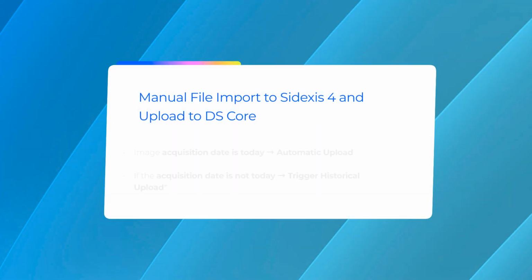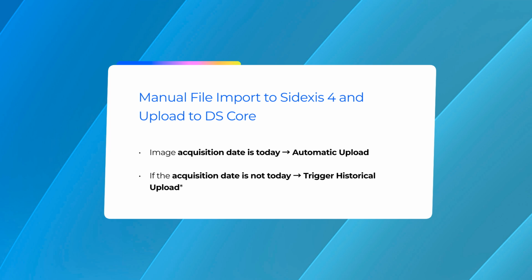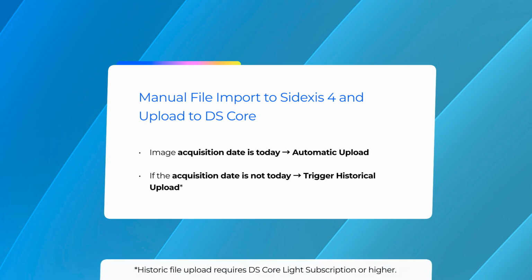Please note, when you manually import a file into the Sidexis 4 patient database, it is marked as a historical file if the acquisition date is not today. In that case, the historical file process must be triggered from the patient's media library in DS Core to upload the file. If the image was captured today, no additional action is required.